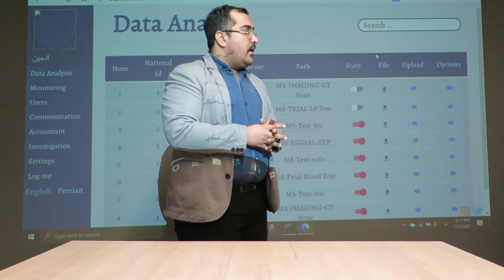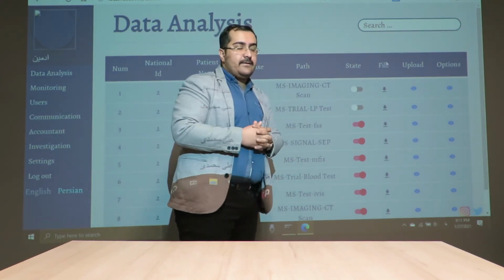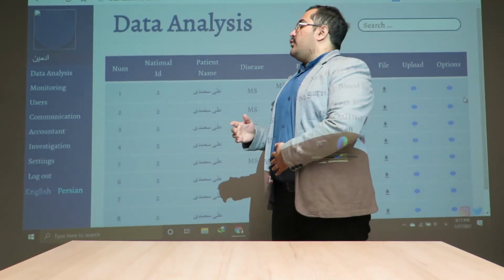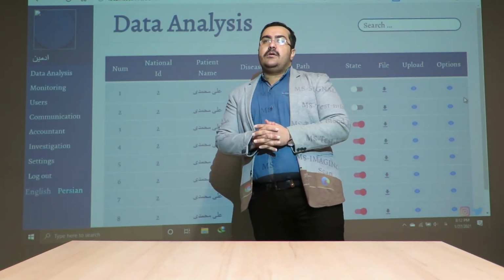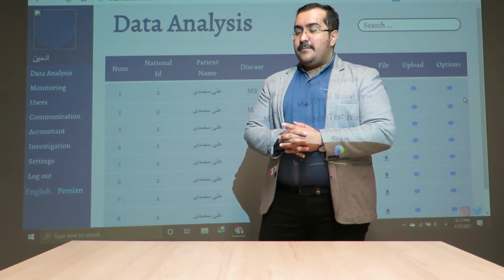This was our admin panel, and there are different kinds of features that we created for people to help them get a better treatment solution and have a better life.